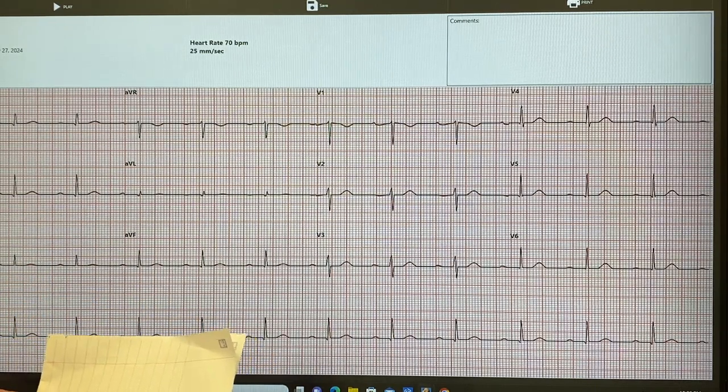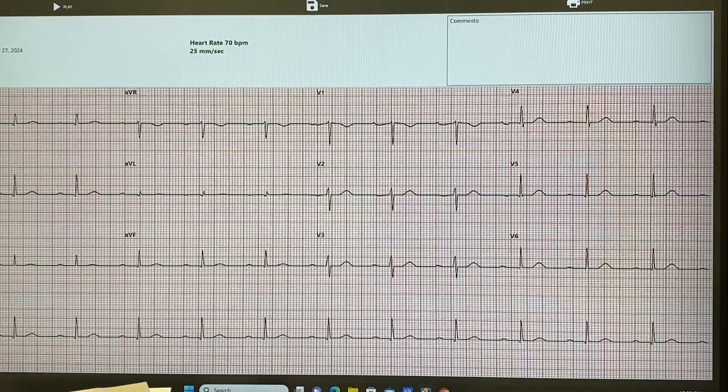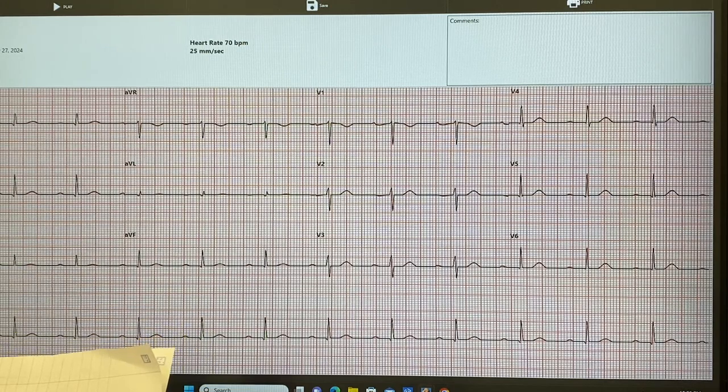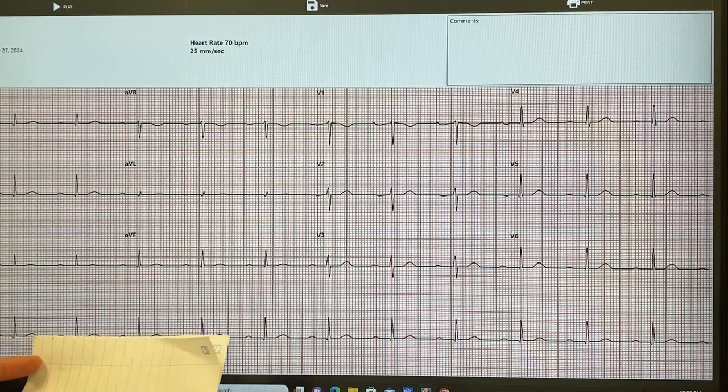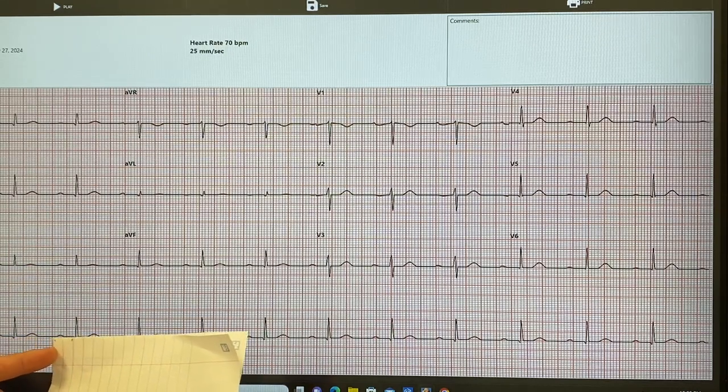So first of all, which one are you doing? Are you measuring if it's prolonged or not, or marking out if they're consistent? Okay, I'm going to first look if they're consistent, and then I'll see if it's prolonged. Is that a valid order to go by? That's fine.